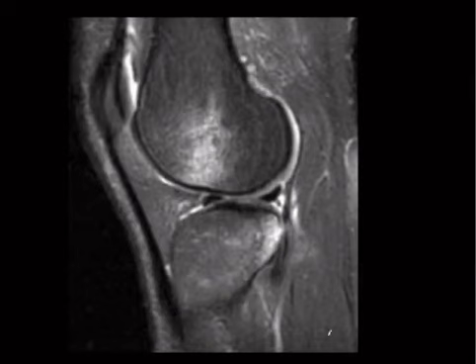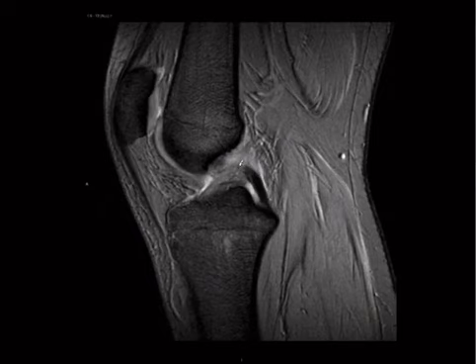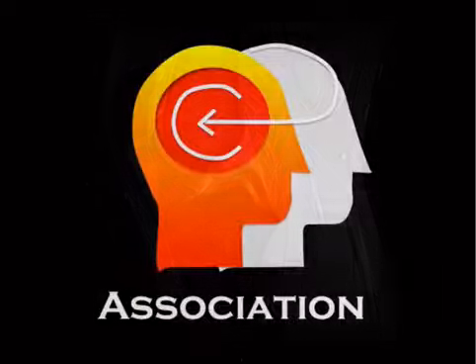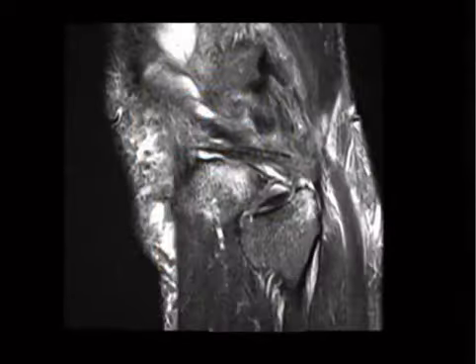So, edema in the bone here, edema in the bone here. This is a so-called kissing contusion sign, strongly associated with a tear of the ACL. So PCL here, ACL is supposed to run like this. Don't see fibers. You want to see fibers. Instead, you just see hamburger. So that's a torn ACL. So anytime you see a torn ACL, the next place you're supposed to look is the posterolateral corner. Now, why? Who cares?